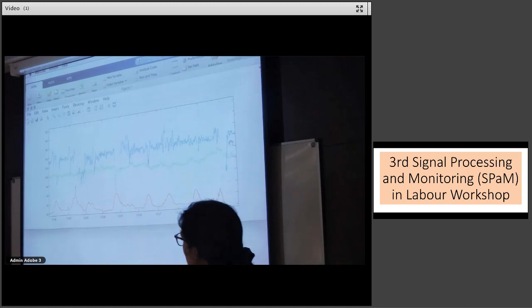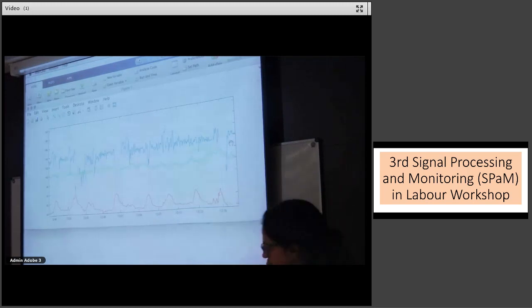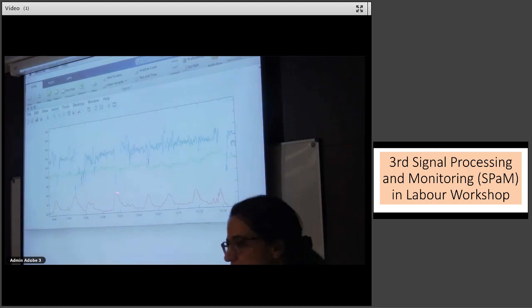Yeah, I would say that if it was a worrying variable, if it was a deeper and larger variable and more repetitive, maybe amnio infusion could do something. But these are really very short, and so for us, we just don't take any notice of these variable decelerations. What about dilation? I don't know. No information.